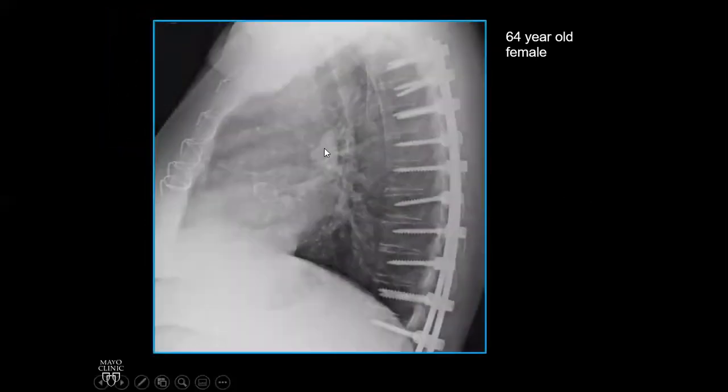And we're at a level about here. So here's our interlobar pulmonary artery. And that little circle is the right upper pulmonary vein, which, as you can see, is running superior inferior. Together, they make a little opacity that you can see on a lateral radiograph out here.